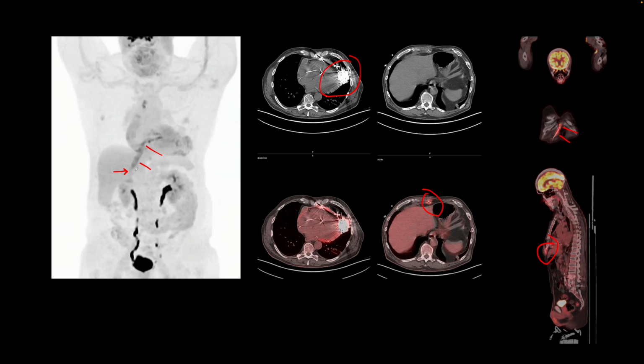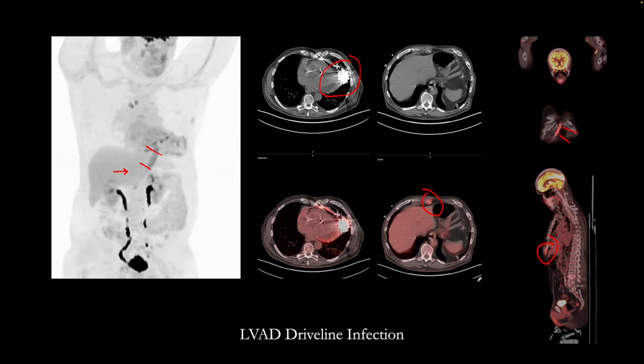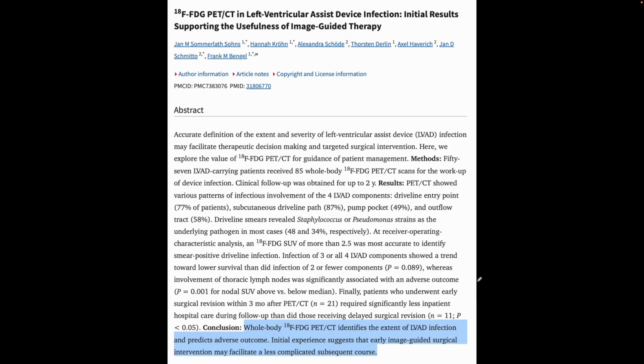Since this opens on the skin, this is predisposed to infection, and this was picked up incidentally on an FDG PET-CT scan performed to stage their cancer. Here is an interesting article on this topic, and the authors conclude that whole body FDG PET-CT identifies the extent of LVAD infection and predicts adverse outcome.